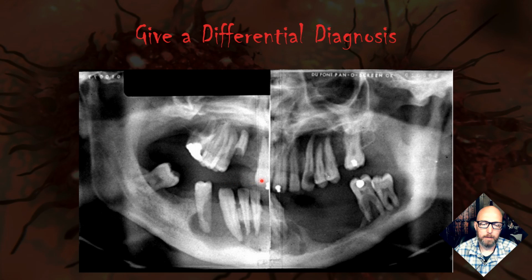And what about this? Same or different as that previous case? Is it scooped out? Yeah. Is that just from a periapical lesion? No, and Langerhans can occur more at the midroot level, although a lot of times it does look like it's at the apices. Some of this does look like it could be florid cemento-osseous dysplasia, but here it eats through all the alveolar bone. Here it even extends back into the ramus. Very extensive destruction. So that was another case of Langerhans cell histiocytosis.